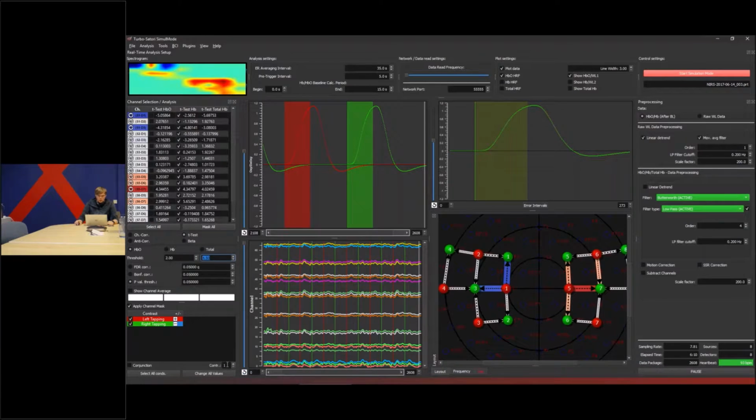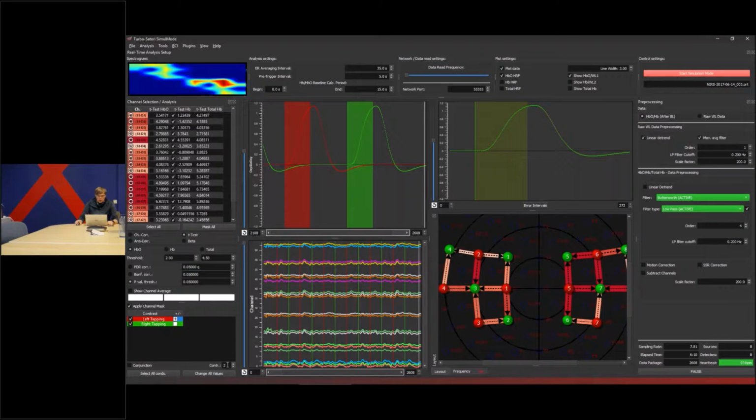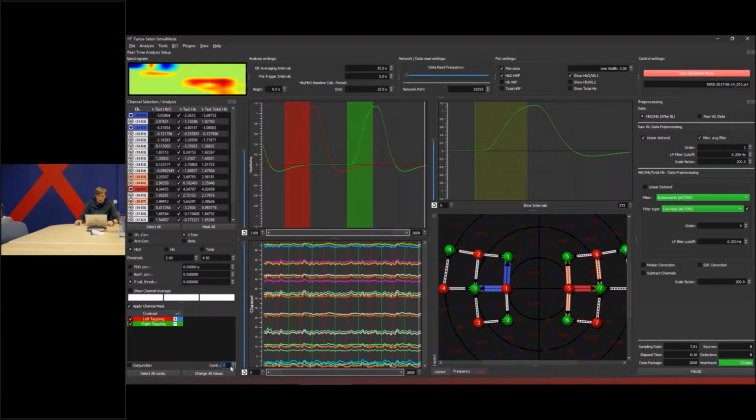And if I want to strengthen that, I can combine it with the conjunction analysis, to also check that it is really active. I can define a second contrast and run a conjunction analysis, which then ensures that my condition is also active and not negative.